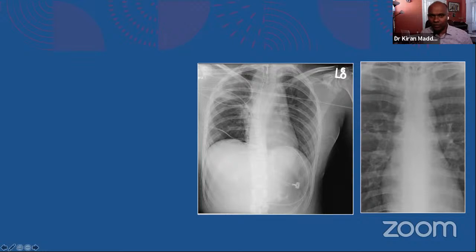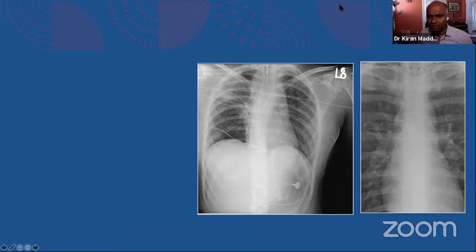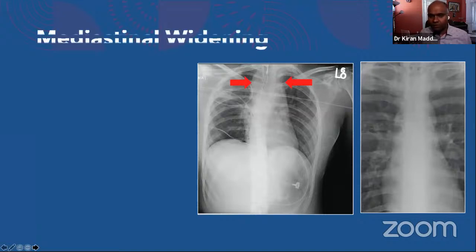So what do you think? Anybody willing to volunteer for this case? Okay, I see some answers there. Yeah, there's some chat box that helps me a lot. Oh, very good. So Victor, good job there. It's a mediastinal widening. So the rest of the people, what do you think can cause mediastinal widening and how significant is this in a trauma? So yes, he is right.